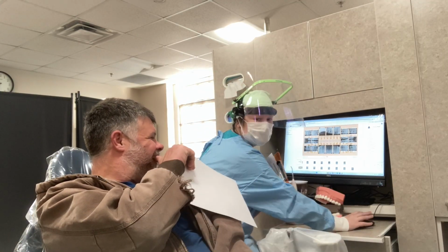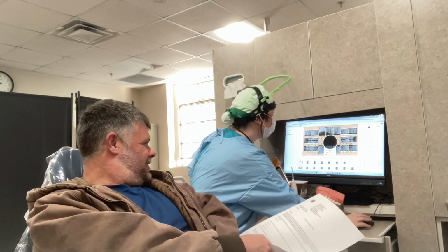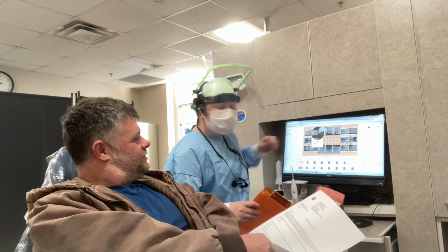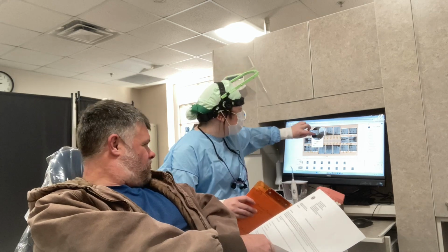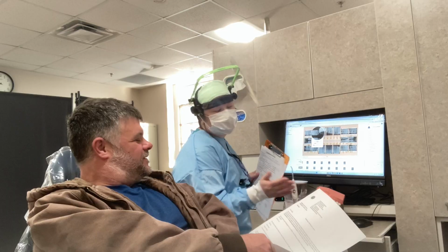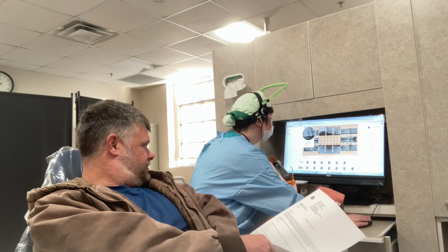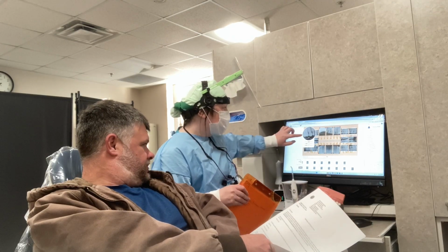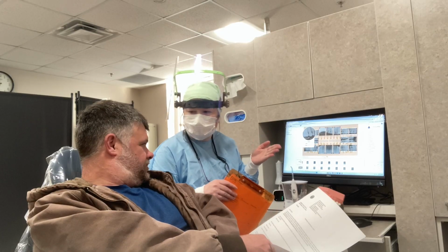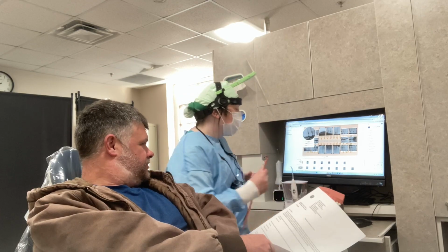Can you not see this one at all? I'll show you. I have one image where you can, but it's really hard to see. I didn't get a great picture. You can barely see it, but this right here, because it's right at the gum line, you can see just that little bit of something right there. If I would have gotten a better picture, we could see it really well, but that's as good as I got. But the typical enamel structure, let me see if I can zoom in. Okay. It's going to be very intact. We're looking at very thick enamel that goes through, and it's also uniform and symmetrical. So we know that's enamel, and if it had a cavity, it would have a little shady gray area in there.